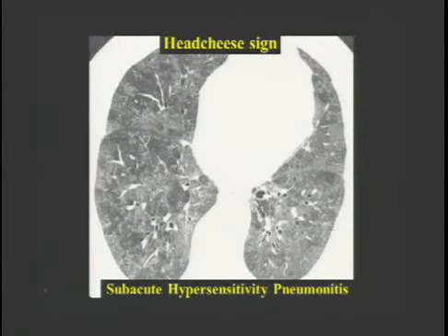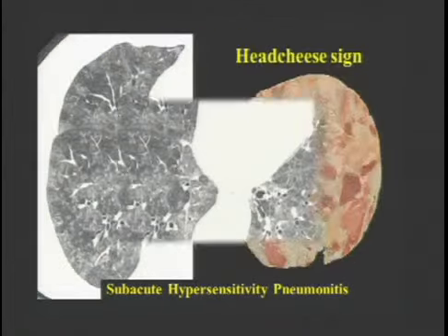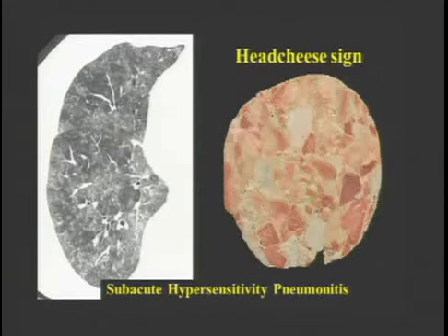Now, here another nice example of the head cheese sign in subacute hypersensitivity pneumonitis. And this is why I call it the head cheese sign.